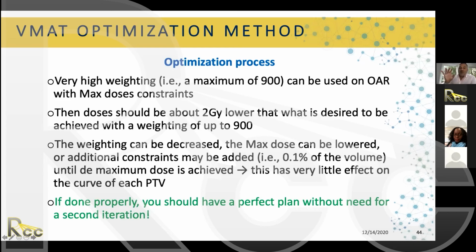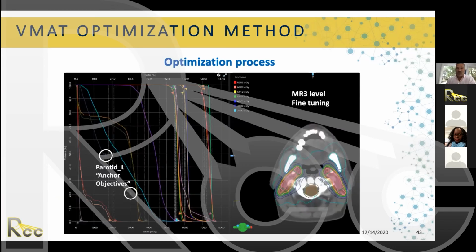See, we went through each step here, and we never came back to contour extra structures. We get out to see the distribution, because if you pay attention and you have met all your OR structures, mean doses or max doses, and your PTV shoulders are perfectly following the lower and the upper limits, then you're done. Most probably you're done.